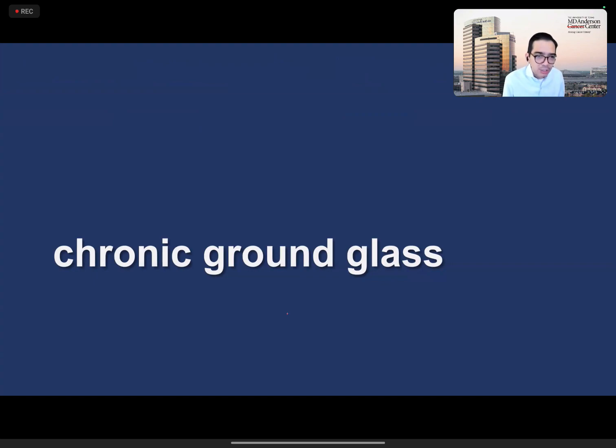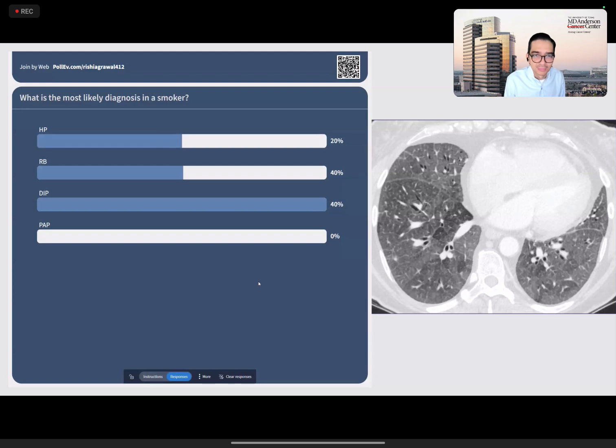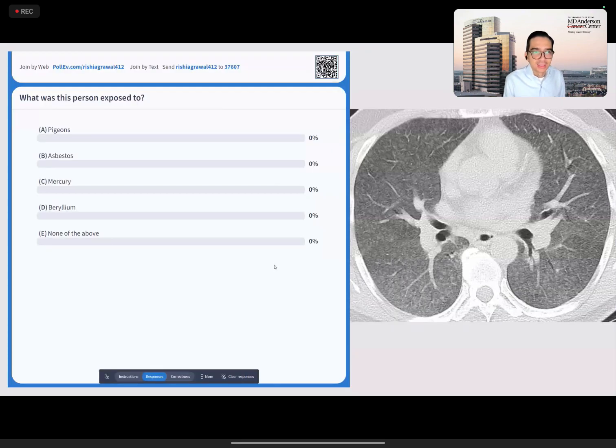Okay, so let's now talk about chronic ground glass, and I have a couple warm-up questions for you. This part is going to go a little bit faster. Okay, most people said DIP. What was this person exposed to?